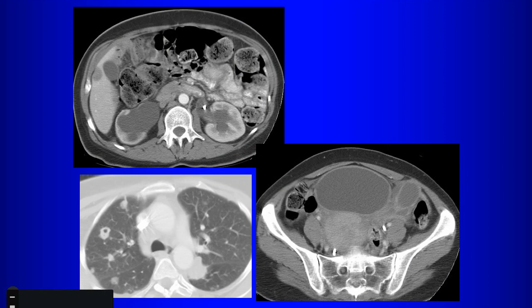yeah, there's some cystic mass there, cystic masses. How do we put those findings together? Choriocarcinoma, is that associated with cavitary lung lesions? By the way, yeah. Anything else? Squamous cell metastases. So squamous cell metastases are associated with cavitary lung lesions when they metastasize to the lungs. So what tumor would this be then?